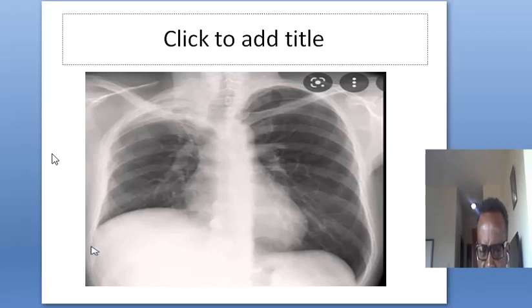If you see this lung, this is the left side, because of the aortic knuckle and cardiac shadow, the right diaphragm is up and the left diaphragm is lower down. This is the left side, this is the right side. So when we compare the two lungs, the right lung is significantly compromised, with collapsed volume. There is volume loss.